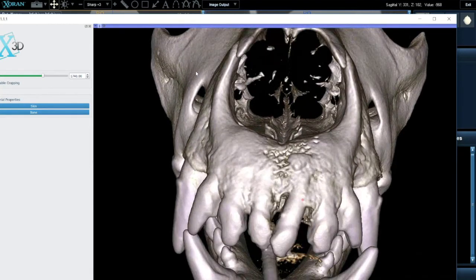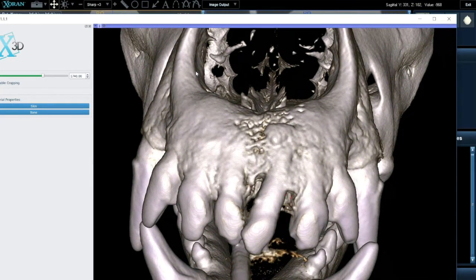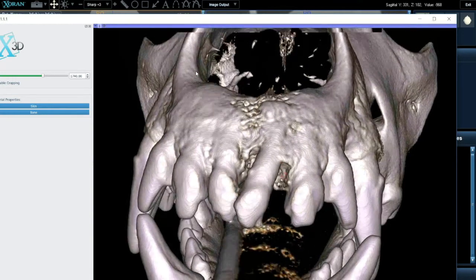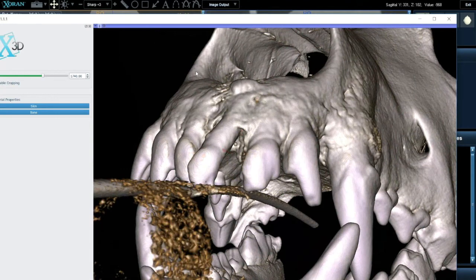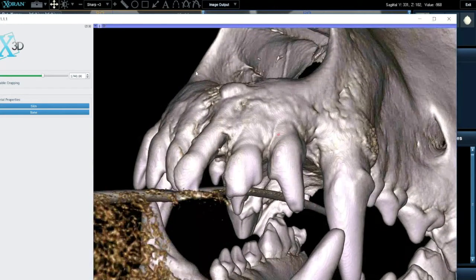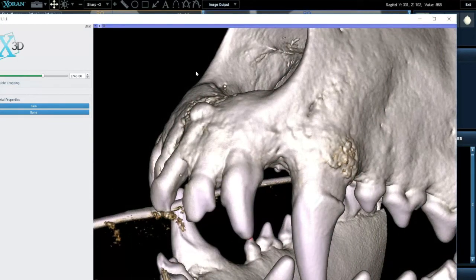And if we zoom more into this spot, we will actually start to recognize the shape of the bone loss. It's more of a flute-looking, significant two-wall defect in most of this around the tooth. So this is a one-wall, two-wall defect with complete bone loss on the buccal aspect. There would probably be some mobility as well, very localized. Otherwise, we don't see this sort of bone loss in other parts of the mouth.